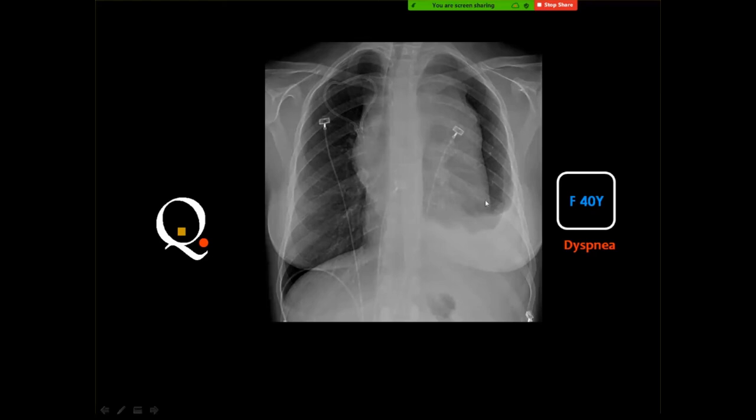Lymphoma. Okay, then let us assess all the possibilities. Retrosternal extension of the thyroid: if you see the upper border of the mass, this will exclude this possibility because in retrosternal extension, you cannot see the upper border of the mass. The other possibility of lymphoma is a very good possibility because there is a big mass on either side of the mediastinum.